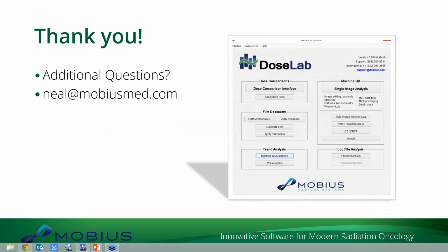Somebody asks, is there an easy way to check leaf speed? Yes, I think I showed that with both the VMAT and dynamic MLC QA tests. You can do that. You can also do it with the log files with the FractionCHECK part of the software.